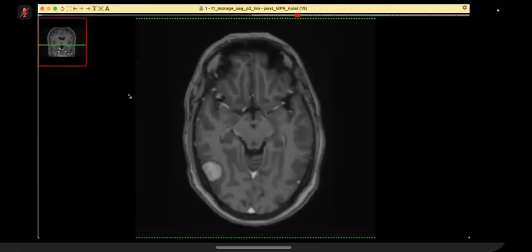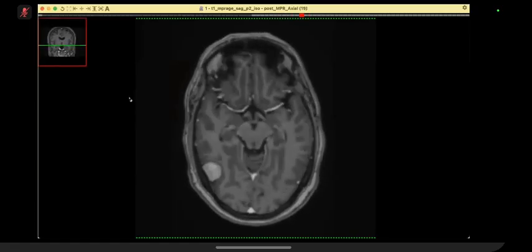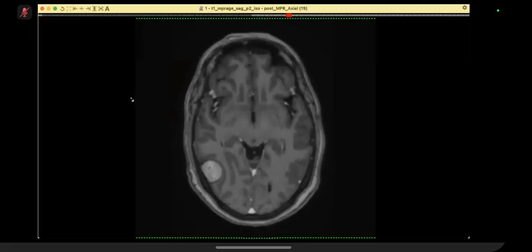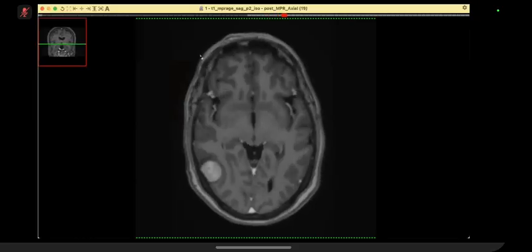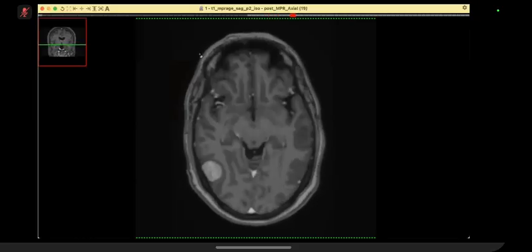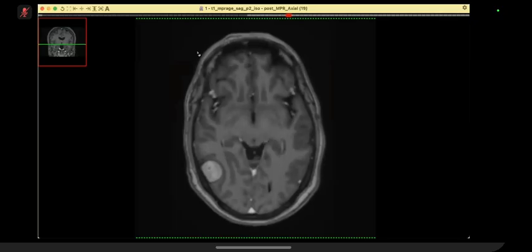Yeah, it's an avidly enhancing lesion. From this location, I'm just concerned if it's intra or extra-axial, because this pattern of enhancement without significant edema may be suggestive. Maybe this is an extra-axial meningioma or something like that. I can't see that the underlying cortex is splayed or buckled below it, but I couldn't notice any meningeal or dural tail to call it a meningioma.